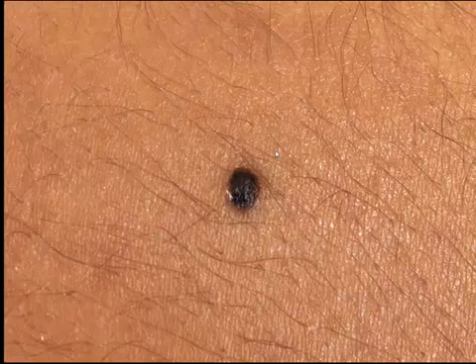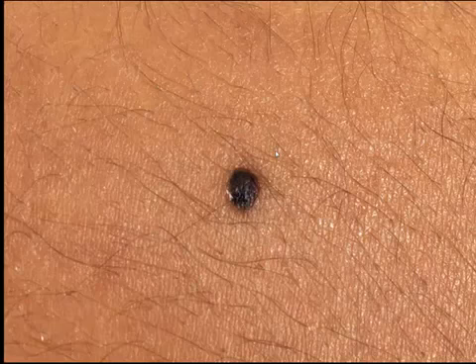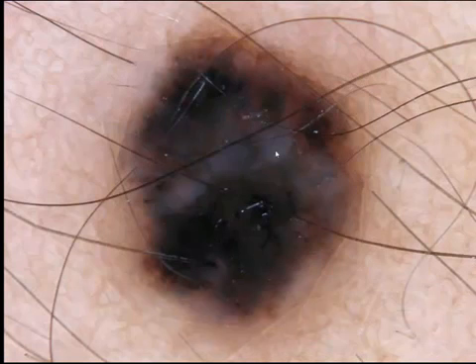Now, always look for clues when you see a structureless lesion. You have to look very carefully sometimes. I'll tell you the last clue. This is a lesion that is clinically a melanoma or a nevus, very darkly pigmented. And now here you see it's a structureless lesion.